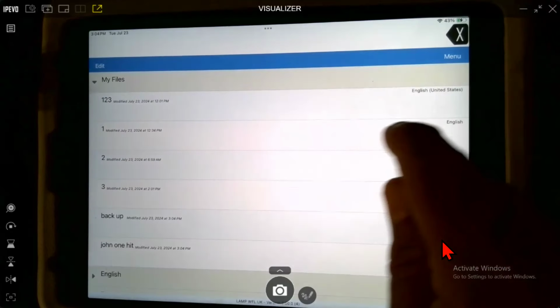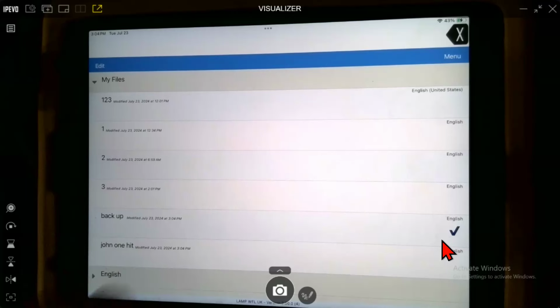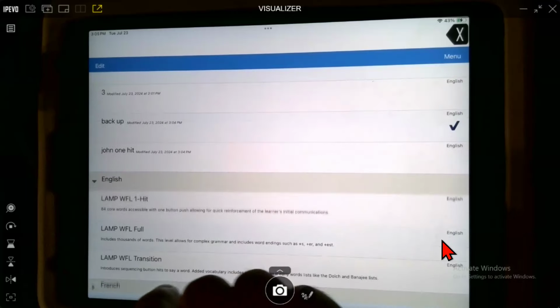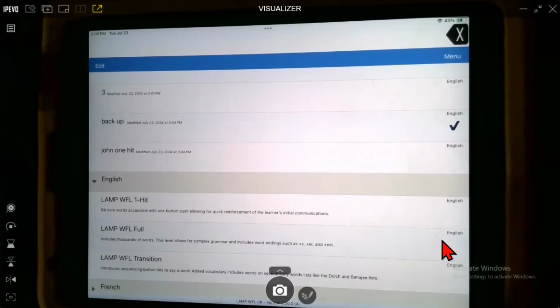The steps for doing it, you can watch the YouTube video again or watch this video when it's on YouTube. But I just want you to think why. The first reason you have to do it is to get files that you can customize. These are locked from the factory. So that's one reason why you have to know how to copy a vocabulary, so that you can manipulate it. But I want you to see the second reason for doing it.